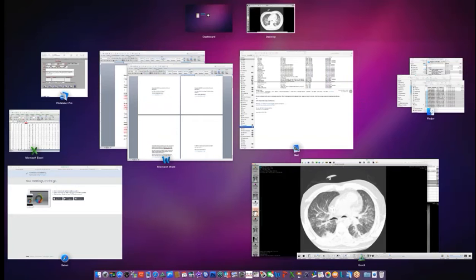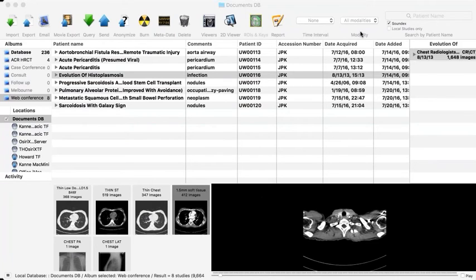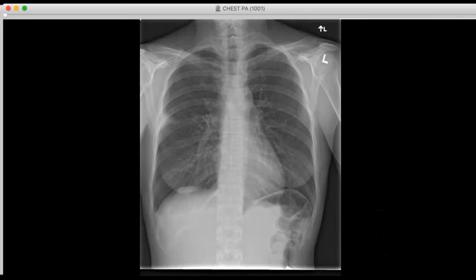I can show a few here. All right, so you should see a chest radiograph. Everybody see my screen? Very good. Okay, I just see your database screen, I haven't seen the image yet come up. Oh, okay. I know how to fix that. Sorry, maybe it's showing on another panel. Let me try that. Yes, there we go.